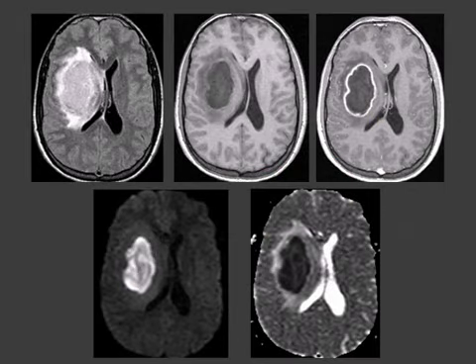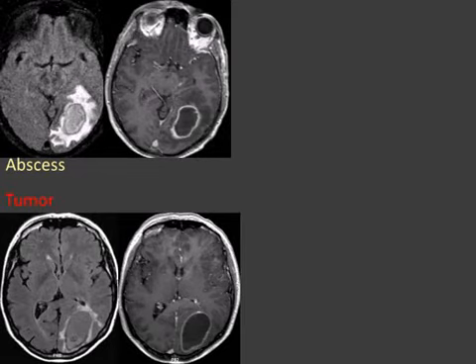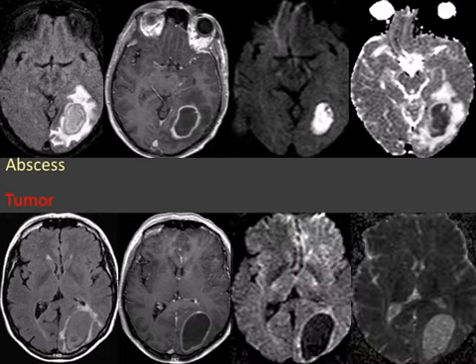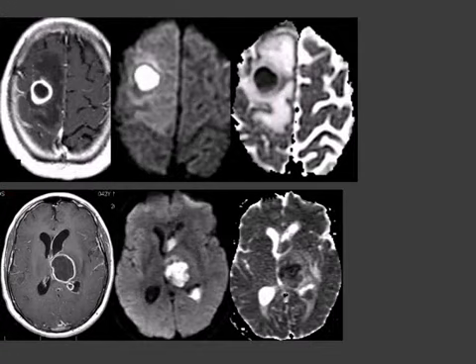So this is a classical brain abscess. There is no discussion what this is with this diffusion. Very bright on diffusion, very low on ADC. These two lesions look the same. One is abscess, as I said, and one is tumor. Based on conventional imaging, in an acute situation, you can't really tell. If you do diffusion, this one is bright and dark in abscess, and this one is metastasis, dark and bright, exactly the opposite. So you will use diffusion in an acute situation to distinguish abscess from tumor.